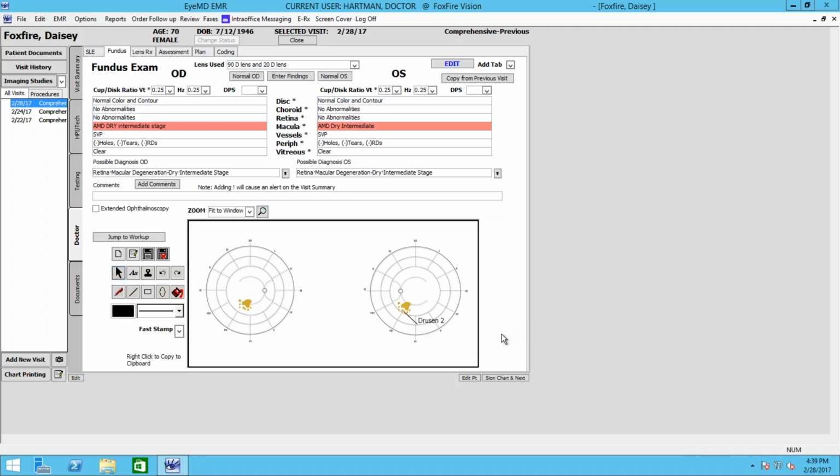There you go. Now, this is the one part in the system where if you try to move forward, it will stop you and say that you have to save it. So the save button is the little floppy disk on the left, this guy right here. Whenever you're done, if you forget to hit save, that's okay. It will stop you, but just know that everywhere else in the system, it saves automatically except for this part. Where is the save? This right here, this disk. Yeah, that's the save.